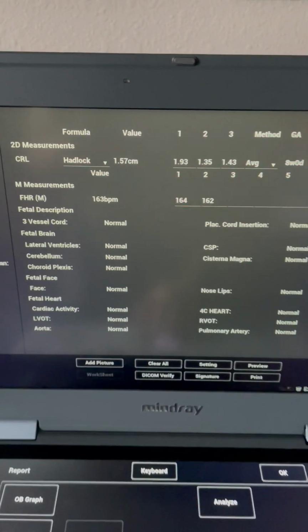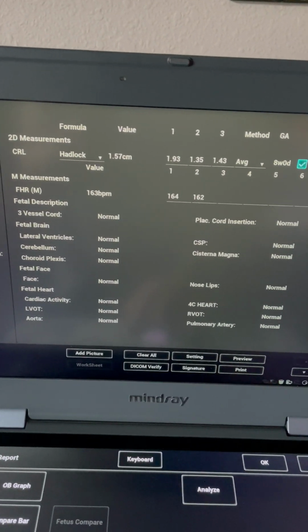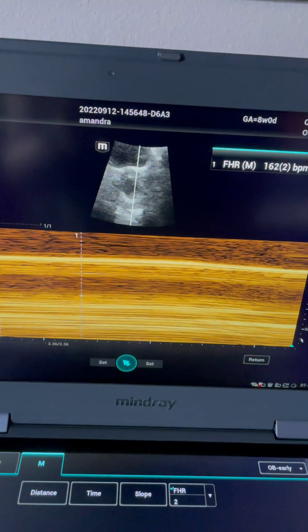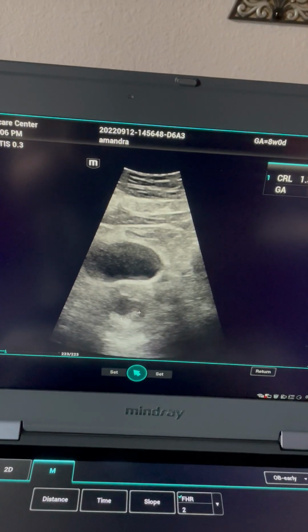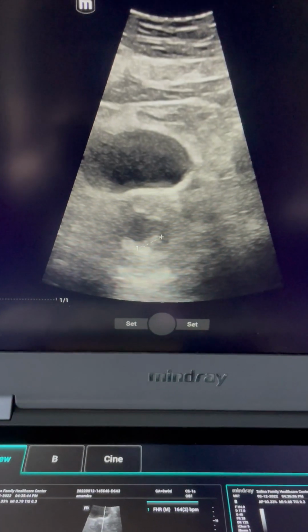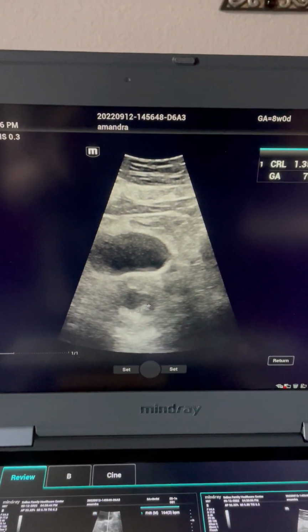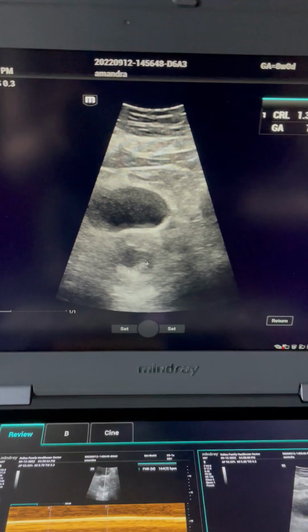So that's how you're going to activate. If you do all of your measurements the first time around, that's fine. What I would encourage you to do is just go in and double click on one of the images that you took before and take another, just measure that again. Even if you have to just measure straight over what you did before, what that does is it will activate your report so that you're able to do your analyze and everything.